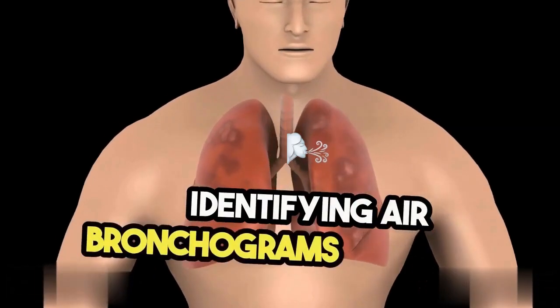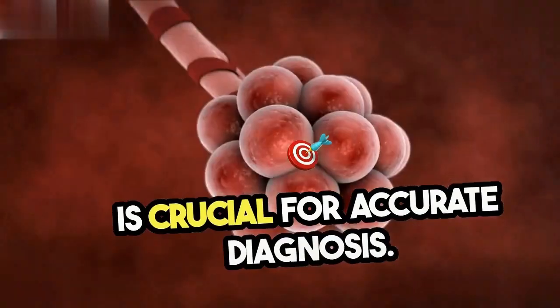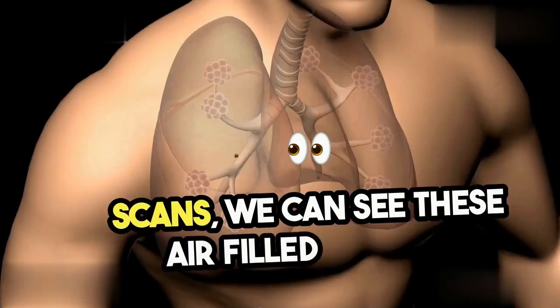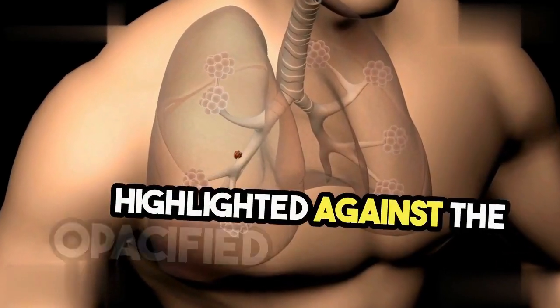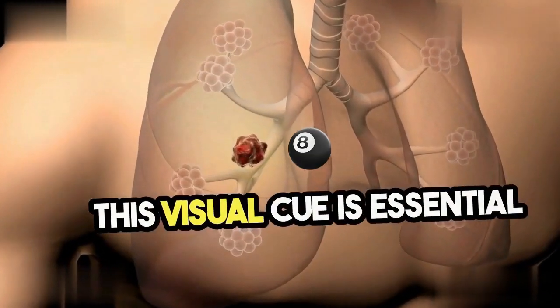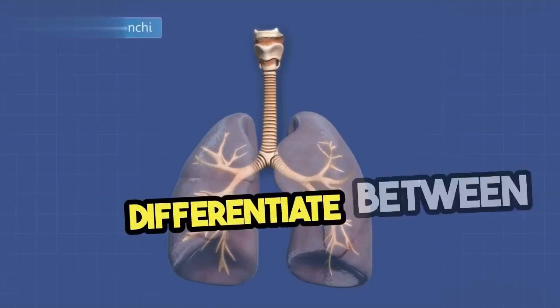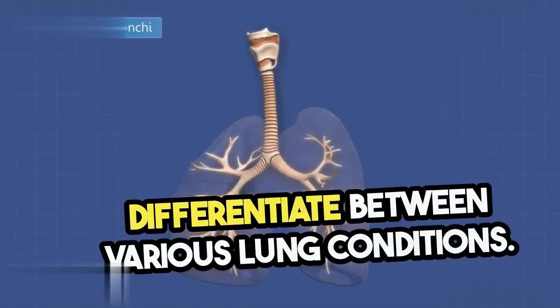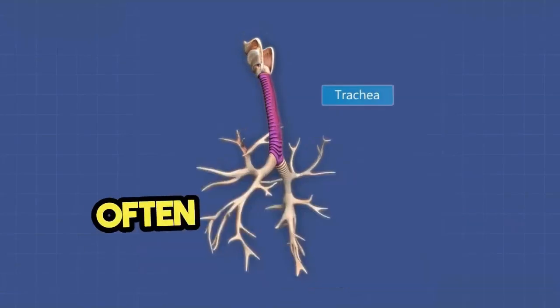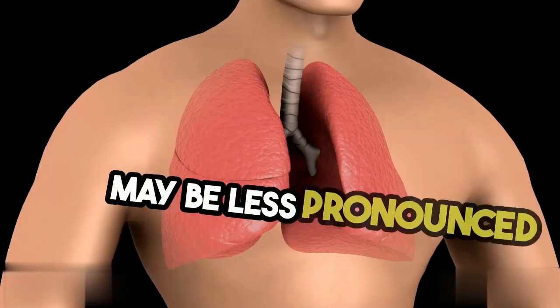Identifying air bronchograms on imaging is crucial for accurate diagnosis. When we look at X-rays or CT scans, we can see these air-filled bronchi highlighted against the opacified lung tissue. This visual cue is essential for radiologists and clinicians alike, as it helps them differentiate between various lung conditions. For instance, in pneumonia, the air bronchograms are often well-defined, while in other conditions, they may be less pronounced or absent.